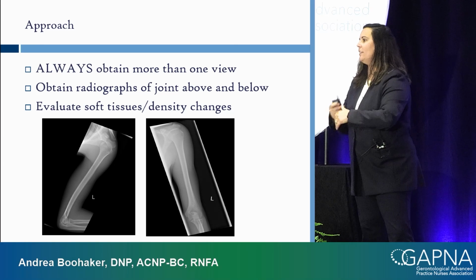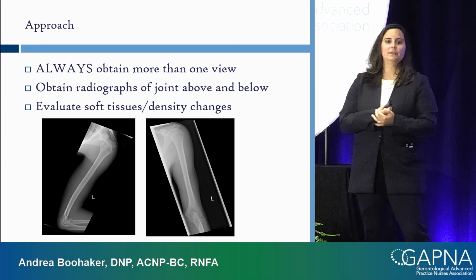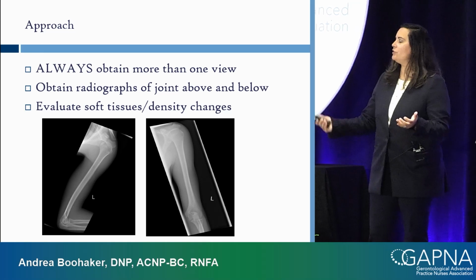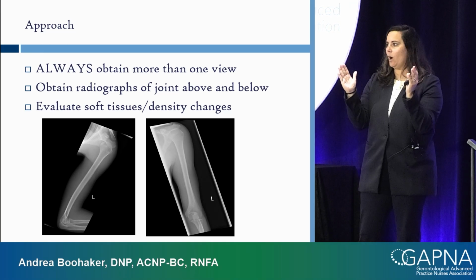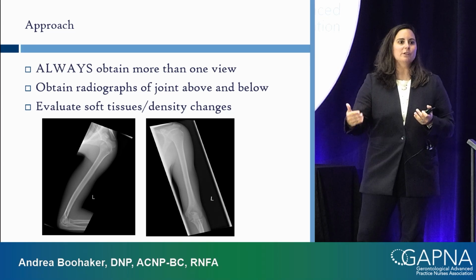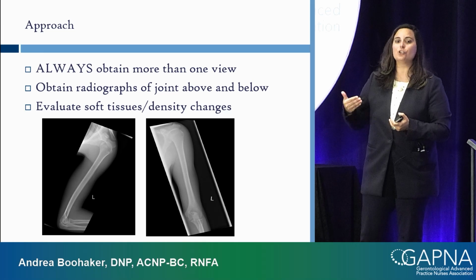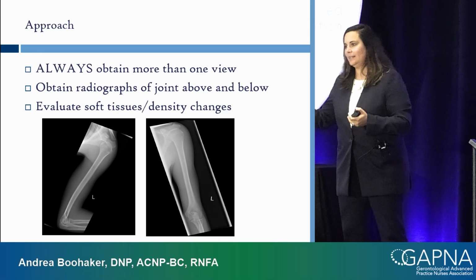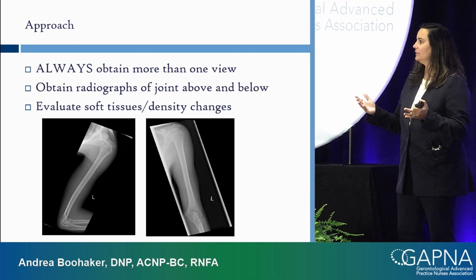Patient comes back a week later because they're continuing to have pain. Now it is in their ankle. They have a dislocation of their ankle, of the syndesmosis, where the syndesmosis is now wide. Okay? We call that a Maisonneuve injury, where you have an injury either at the knee or the ankle, and the energy from the trauma has gone all the way up into the knee or the ankle, vice versa.